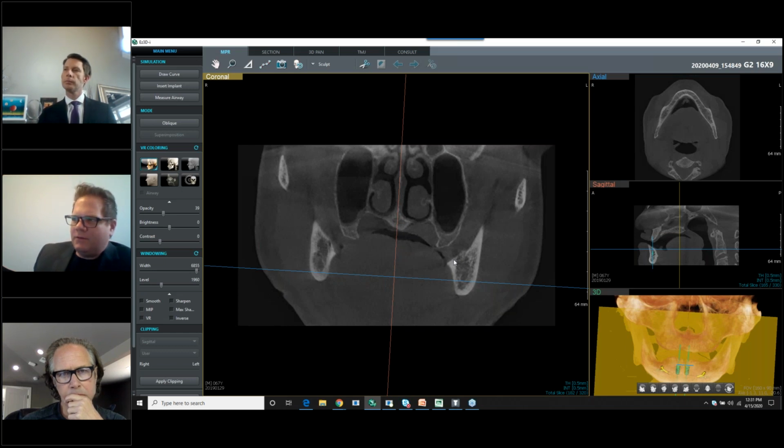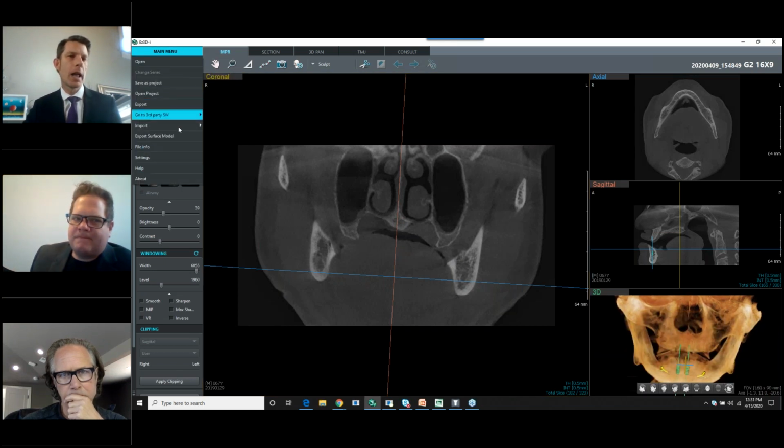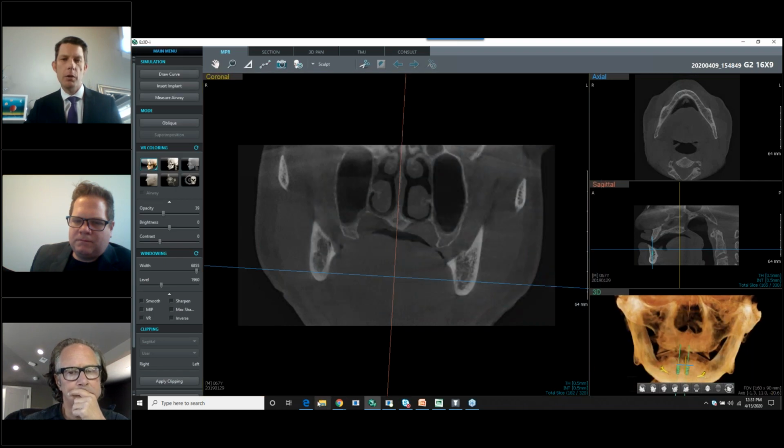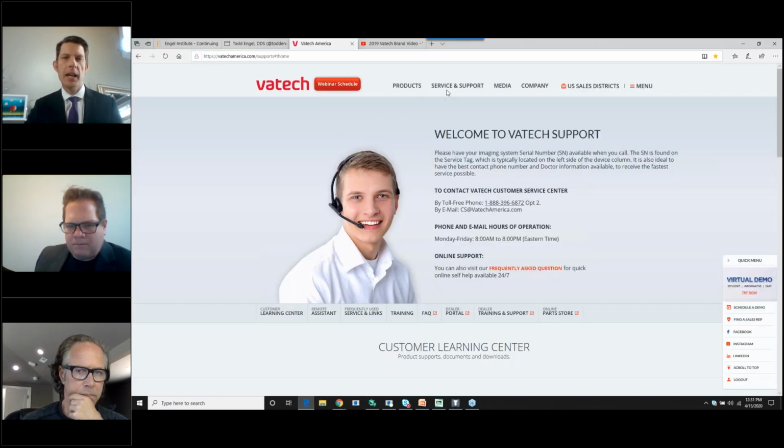Great. And then one more here. How can you tell if you have the latest version of Ez3D-i and how do you upgrade? That's a great ending point. So what I'm going to do is I'm going to come over here to main menu. I'm going to come down to about. I can see my version over here, 5.190. And what we're going to do is we're going to go over to our website and go to Vatech America.